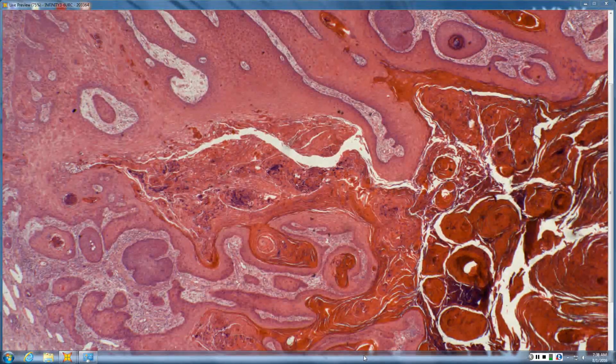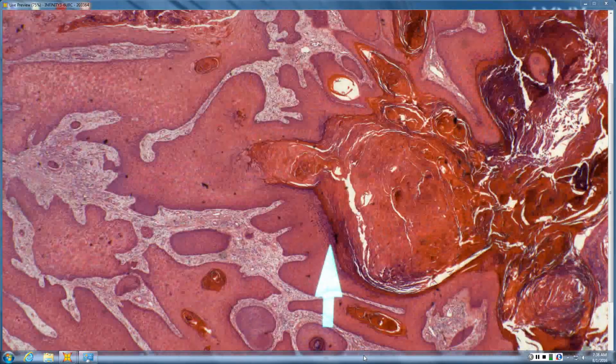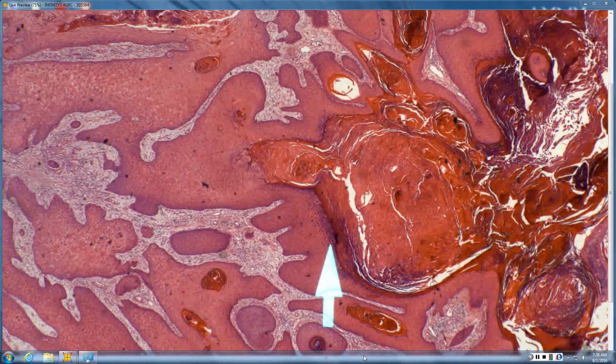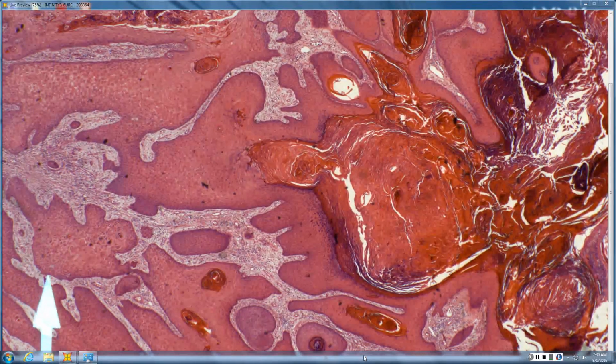So crateriform, eruptive growth begins with hypergranulosis in hair follicles. Those hair follicles expand, become glassy, and merge together into the crateriform lesion, pulling itself along elastic fibers, so that you see amphophilic elastic trapping throughout the lesion.